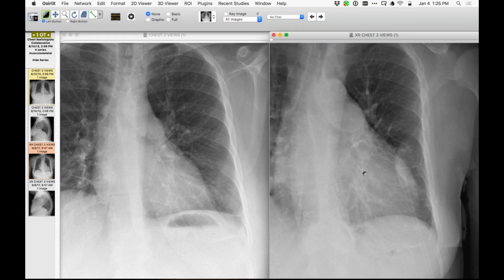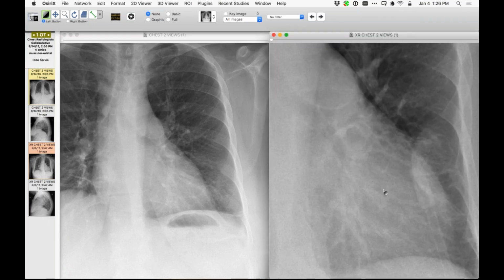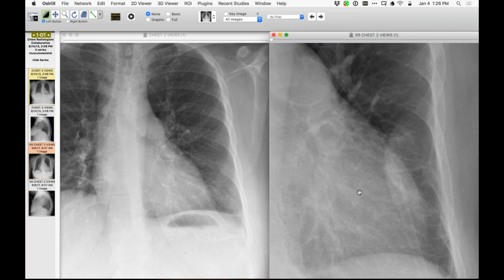Yeah, it looks as if it's been destroyed, blown out in here, maybe from right here. And this could be an extrapleural sign of a rib. That's a good thought. I want to see. I don't think I have CTs to confirm that, but that's a good thought. This person does have end-stage renal disease and has had it for many years. He's on hemodialysis, so there's no reason why this person can't get osteoblastoma or brown tumor.